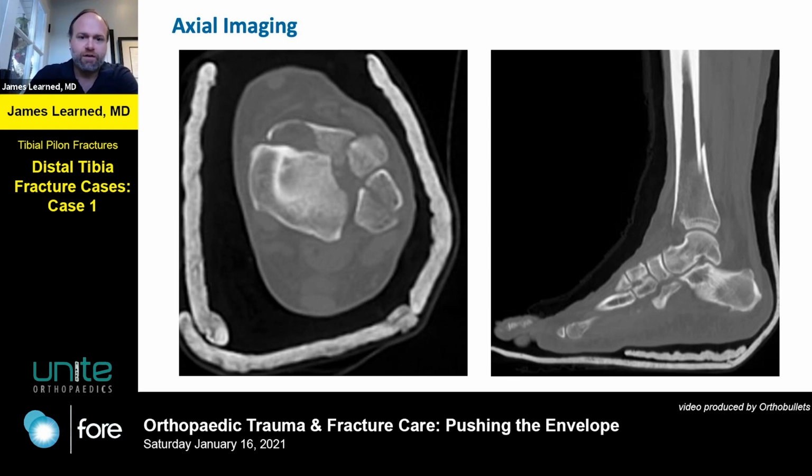So we've got this anterolateral fragment, which appears to be following the fibula. We've got the typical medial fragment, in this case very large without a central die punch piece. And then not displaced from that in this case, we see this posterolateral or Volkmann's triangle piece back here. So kind of a typical pattern, although atypical displacement, or less displacement than is common.